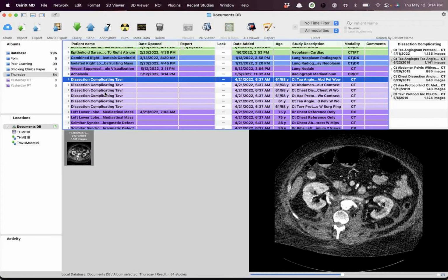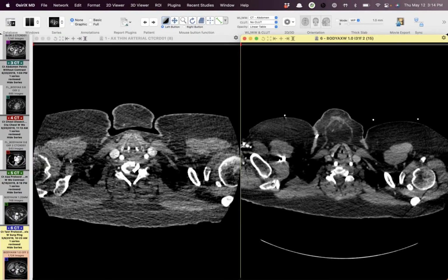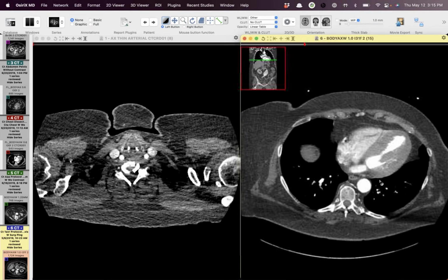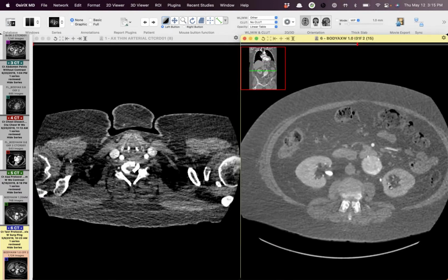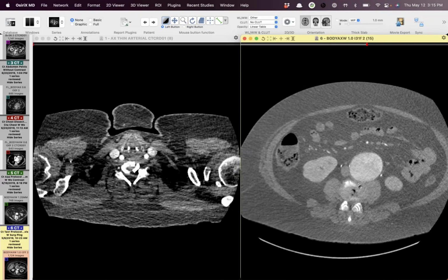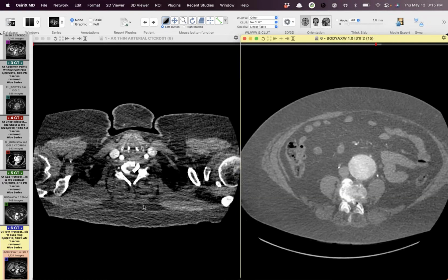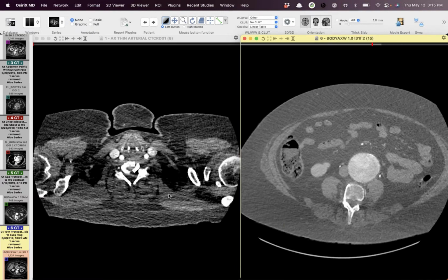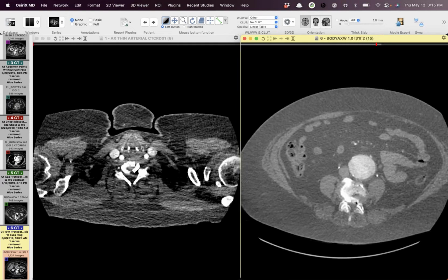All right, let's see if I can get this one in order. So this is a patient that started out, and this is their pre-TAVR CT. The most notable finding was that they had an abdominal aortic aneurysm here. And if you saw the title, this is what comes into play later on with this case. There's a little bit of slow flow, and I think there's heterogeneous opacification of the abdominal aorta there.